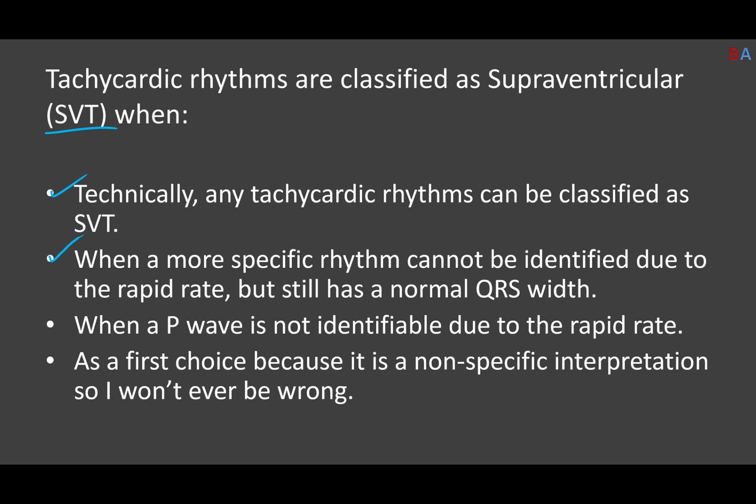You can't identify P waves because of the rapid rate, but the QRS is normal. Calling it SVT is appropriate in those cases. When a P wave is not identified due to the rapid rate. I just said it, so there you go. As a first choice, because it is a non-specific interpretation, so I won't ever be wrong. That's a terrible response. Hopefully you didn't think that. So yes, the second and third items there are what helps us classify rhythms as SVT.